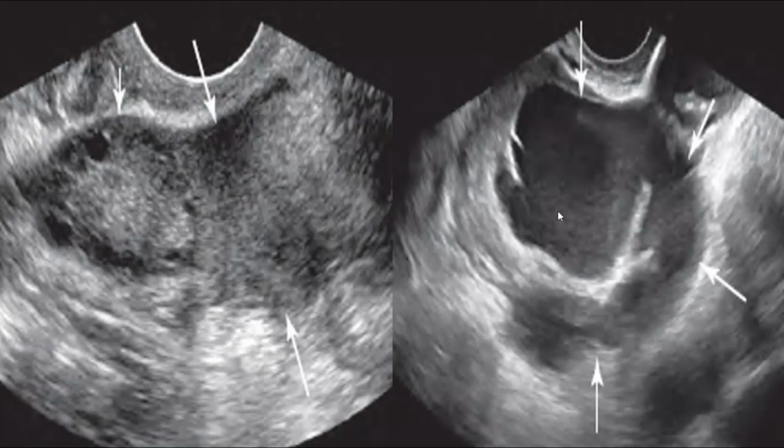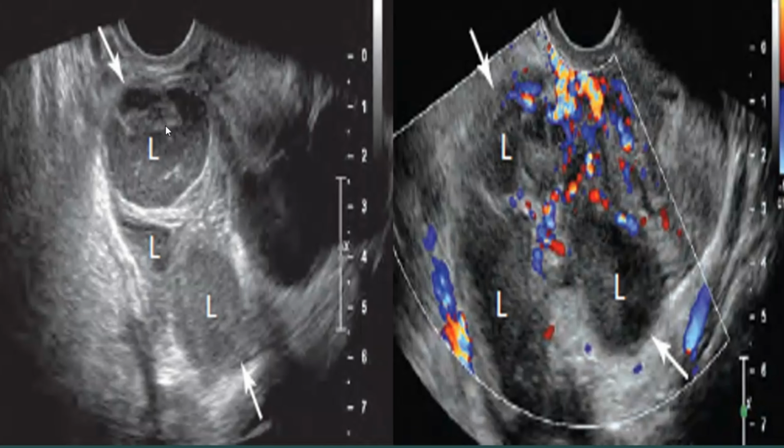And here you can see another case of pelvic inflammatory disease. This is a longitudinal transvaginal image of the left adnexa, and it shows markedly dilated fallopian tubes with internal low level echoes due to purulent material, and this condition is called pyosalpinx, and this is due to pelvic inflammatory disease. And here you can see another case of pelvic inflammatory disease which shows a Tubo-Ovarian Abscess.